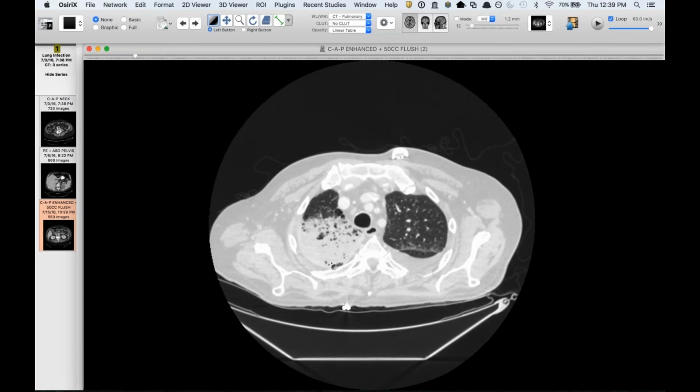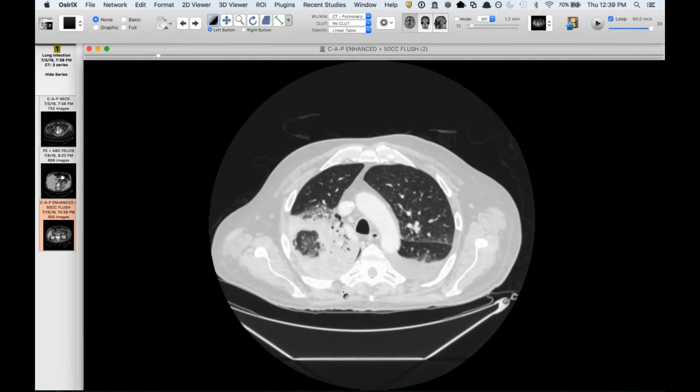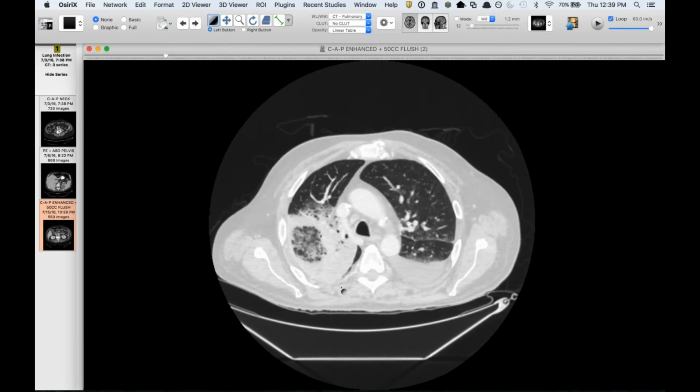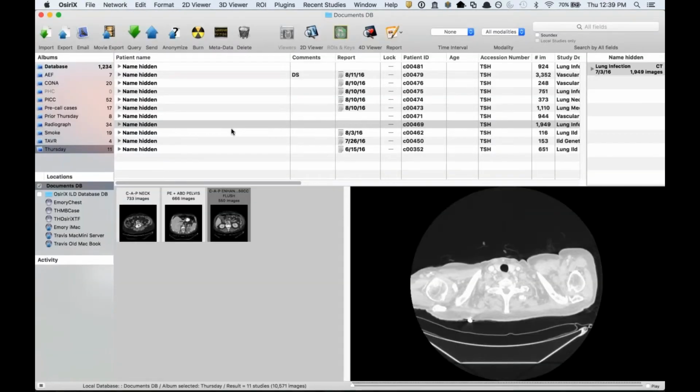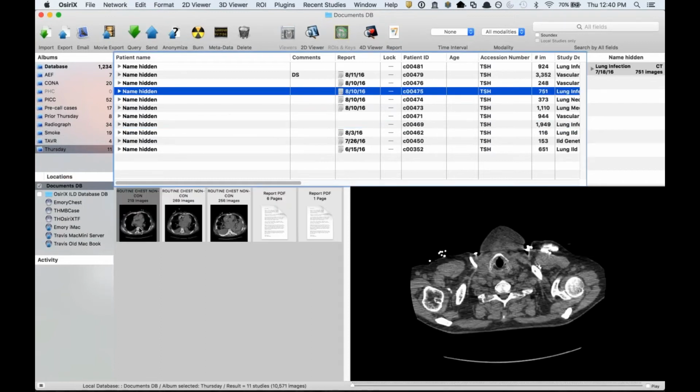So you guys agree that's a good look for mucor? Yeah, very much. That's a classic bird's nest. Yeah, I was just impressed how quickly it evolved. It moves fast. They sometimes resect it if it's isolated, because it doesn't clear very well.